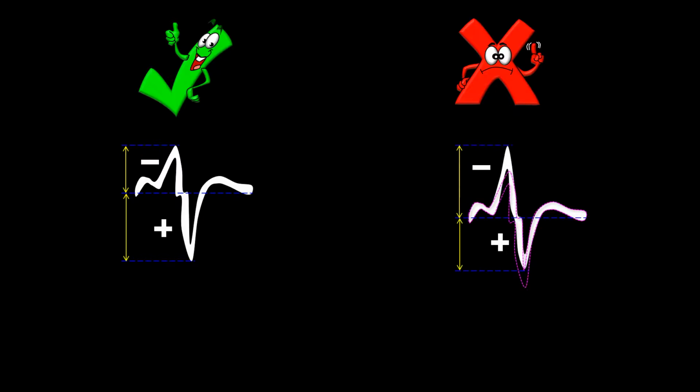It is possible to distinguish encoches from frontal sharp activity with potential epileptogenic implications. Encoches, that by definition are normal, have a first negative wave that is usually shorter than the following positive wave. On the other hand, the first negative wave of an abnormal biphasic frontal wave is larger than the subsequent positive wave.